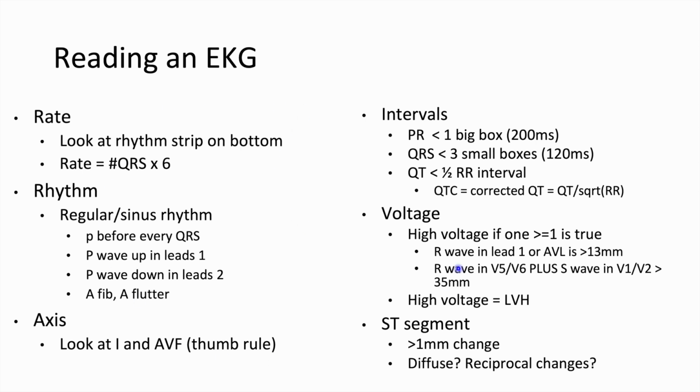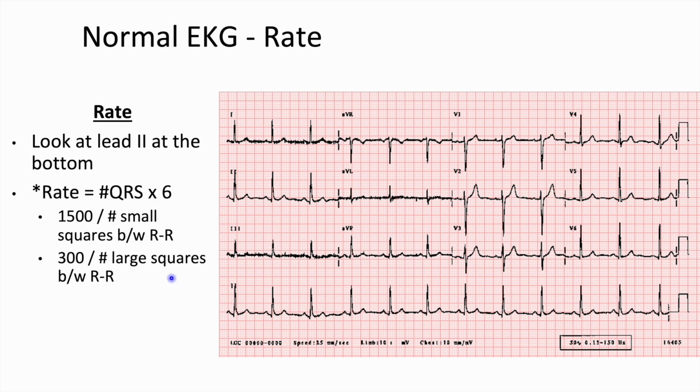And so this is a general overview slide. We're going to go through individually what each one means, and then I'll pull the review slide back up. Let's look at a normal EKG and go through each of these. So this is a normal EKG.